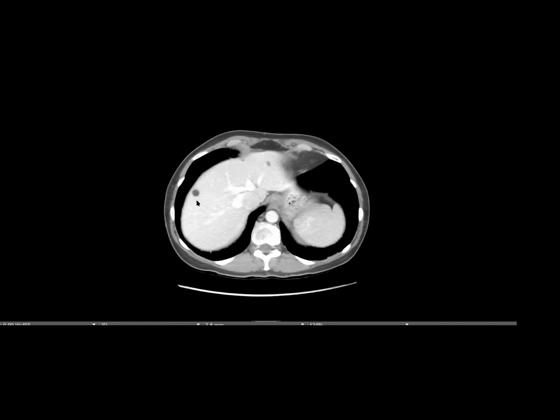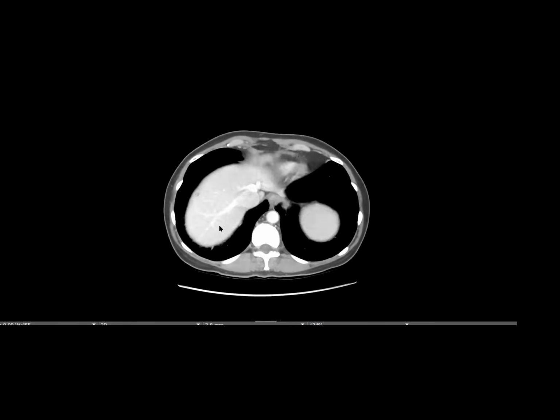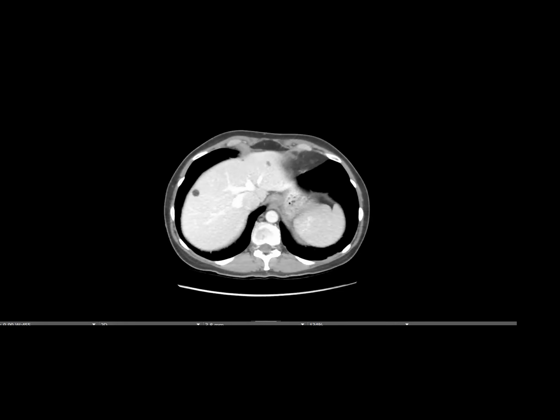See, this is this lesion up here. Any thoughts as to what this could be? And then I can show you the MR images. Are you showing that hypodense lesion that you're on right now? Yeah, this little one. What's the attenuation of that? It's negative Hounsfield units. So it's like a pseudolipoma of Glisson's capsule. Yeah, it's just a cute case.